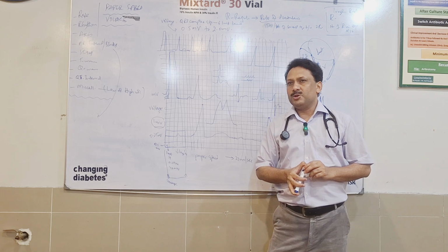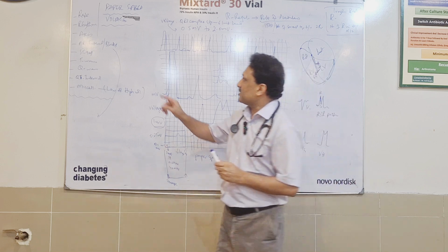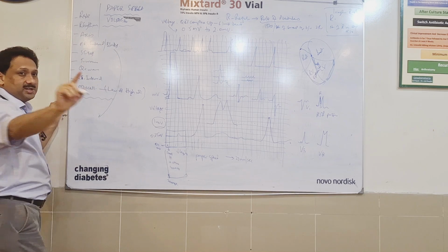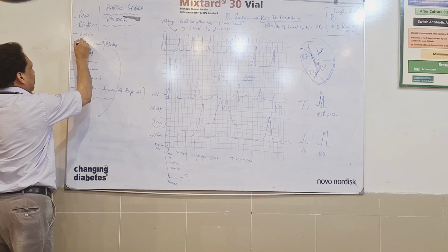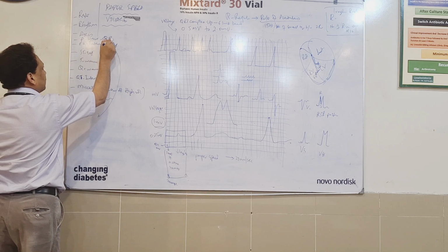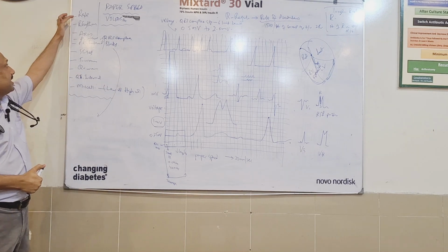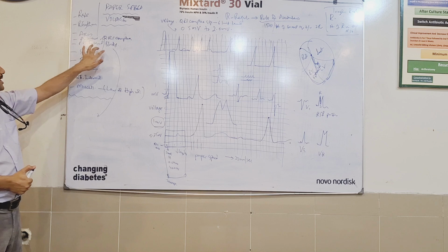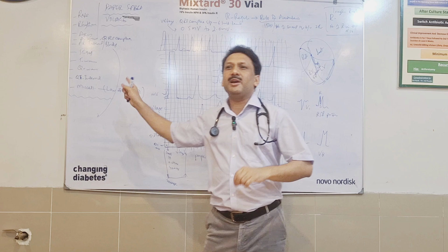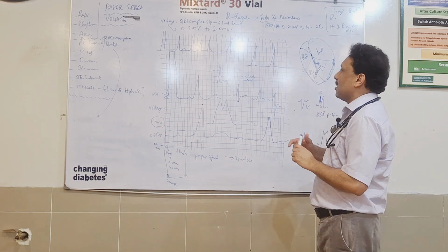On ECG, you can see a lot of things. Among those things, you always see the P wave and QRS complex. Probably we didn't write down the P wave here. Rate, rhythm, axis. Sorry, I forgot two things. One is P wave. Another one is QRS complex. So whenever you read the ECG, this goes like that: rate, rhythm, axis, P wave, QRS complex, PR interval, ST segment, T wave, Q wave, QT interval and miscellaneous. So right now, I am focused towards QRS complex study.